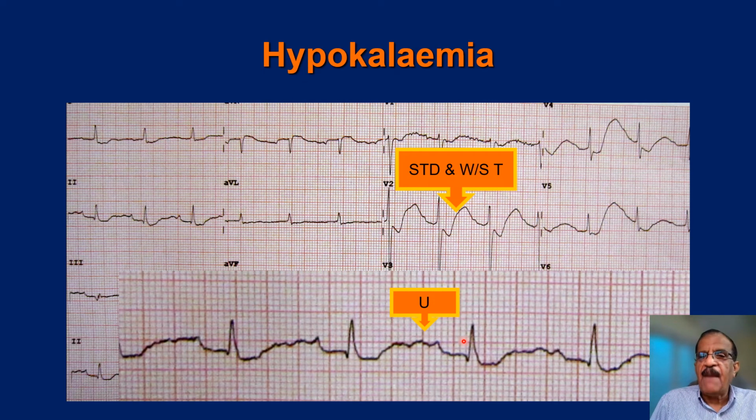So this is hypokalemia, all right? And there are certain clinical situations where you would suspect hypokalemia. Somebody with severe dehydration, fluid loss, diarrhea, there you should suspect hypokalemia, and in that setting the ECG may provide a quick diagnosis of hypokalemia and you can start the treatment, but I always say that hyper or hypokalemia should always be confirmed on a blood test.